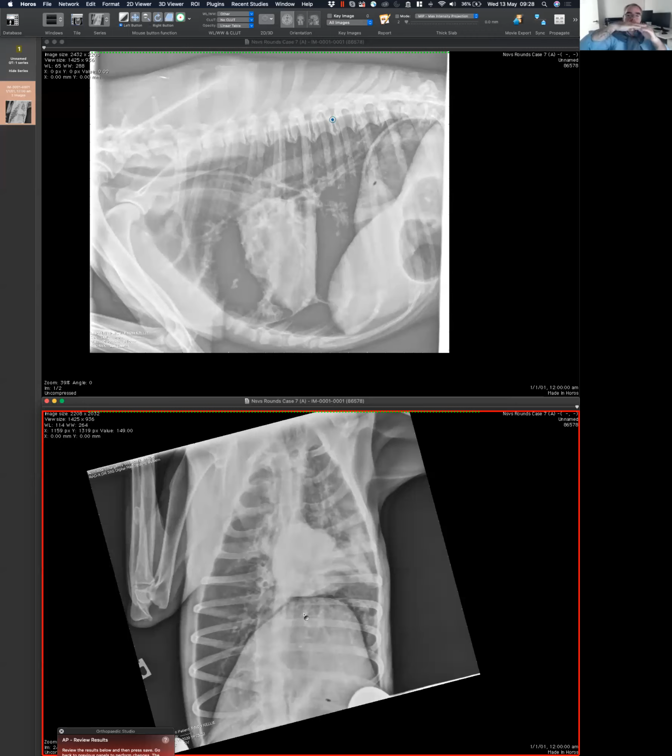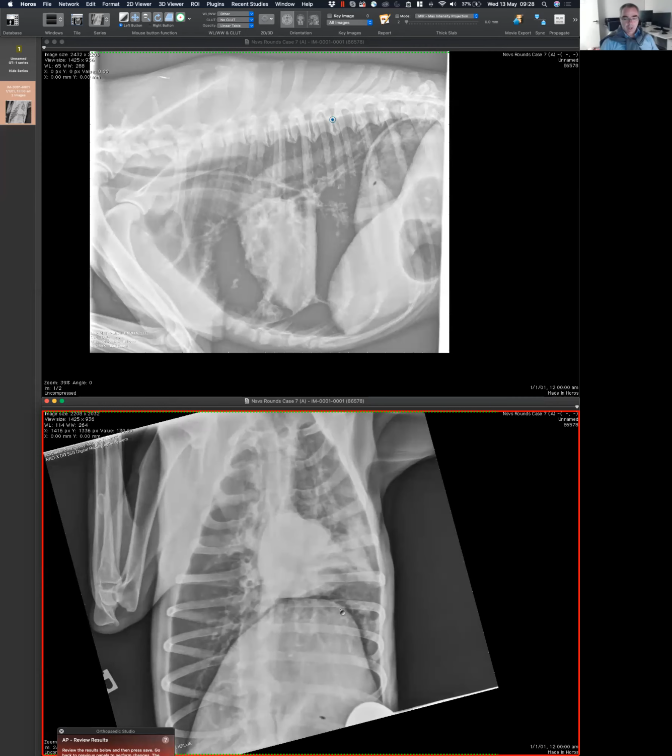If now the lung here gets smaller, the heart falls. It's not that it elevates, it falls. But as it falls, it separates from the sternum. And as it falls, now the heart is going to look shorter. So I think the shorter part is true. I can see that it's going to look shorter, but probably not thinner. I never asked myself that question. That is just thinking aloud. And I would immediately go to the other projection and see.